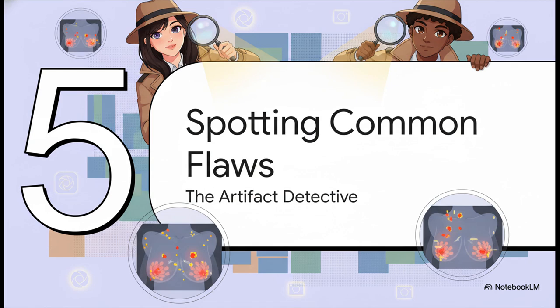Okay, so perfect positioning is one half of the battle. The other half? Hunting down artifacts that can ruin an otherwise great image. So, let's put on our detective hats and learn how to spot the most common culprit.